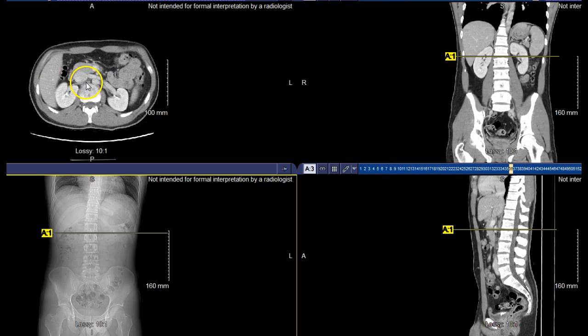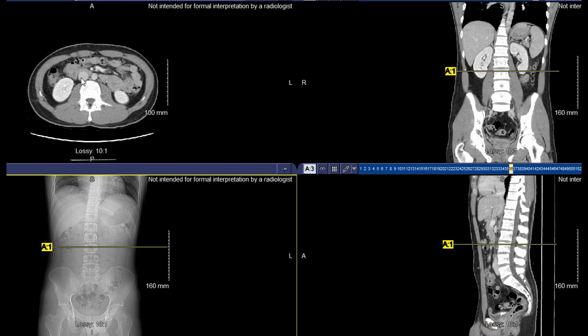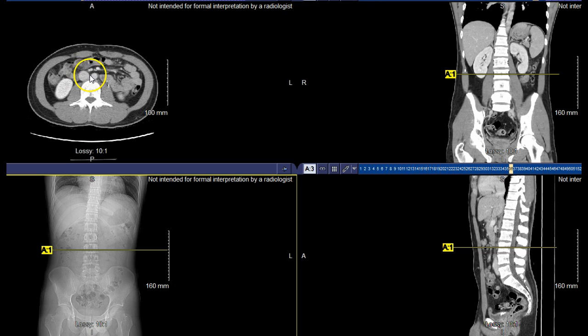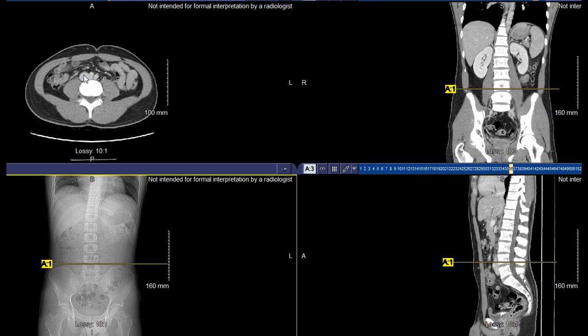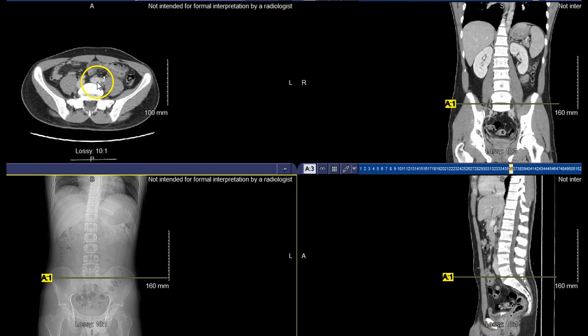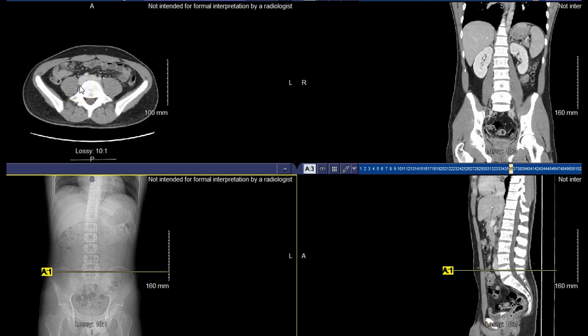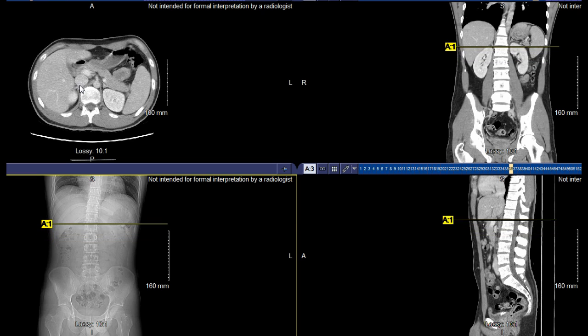So you can be able to differentiate, be able to see those points of connection as we channel through. Including, you can see that point of connection right there then on the right side, so the right renal vein. So those are the important structures going forward. You can see IVC, abdominal aorta. And then eventually as we continue to go down into these pelvic structures, you can start to see those bifurcation points as they split off and go their separate ways throughout the rest of the body. So nonetheless, those are some important vascular-based structures.